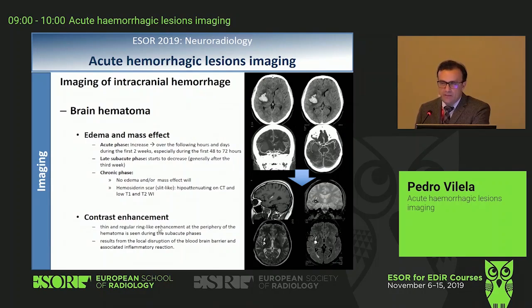Regarding contrast enhancement, when there is a normal spontaneous primary hematoma, there is or can be a ring enhancement at the periphery of the hematoma. And this does not mean that there is an underlying lesion. There is a peripheral inflammatory reaction surrounding the brain hematomas that will give you contrast enhancement. Okay? But it's linear and ring-like around the hematomas.